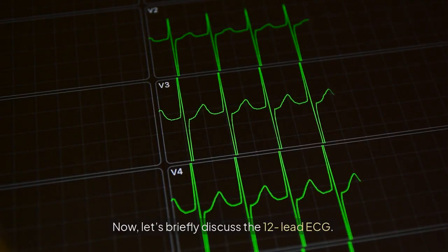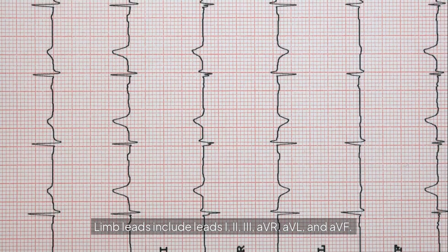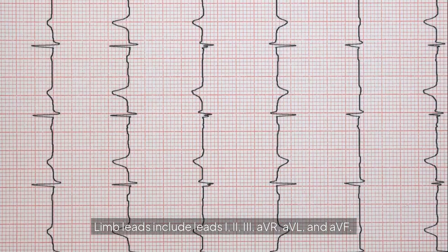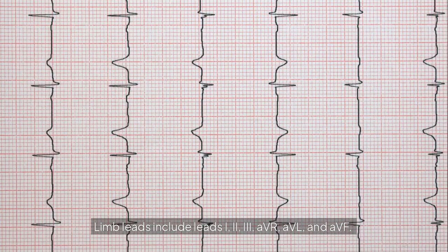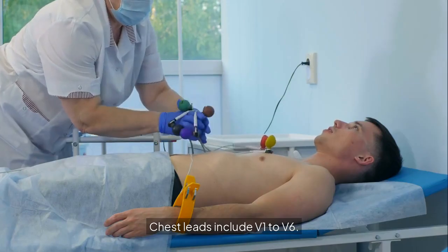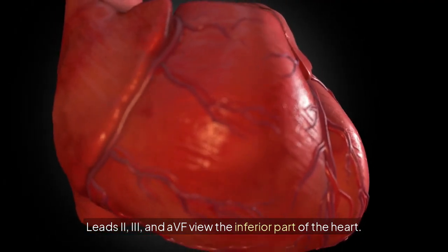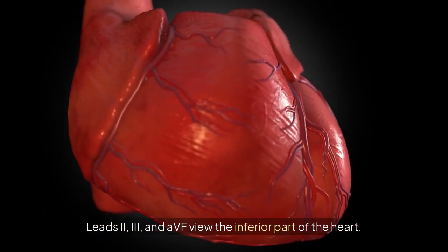Now, let's briefly discuss the 12-lead ECG. Each lead provides a different view of the heart. Limb leads include leads 1, 2, 3, aVR, aVL, and aVF. Chest leads include V1 to V6. Leads 2, 3, and aVF view the inferior part of the heart.